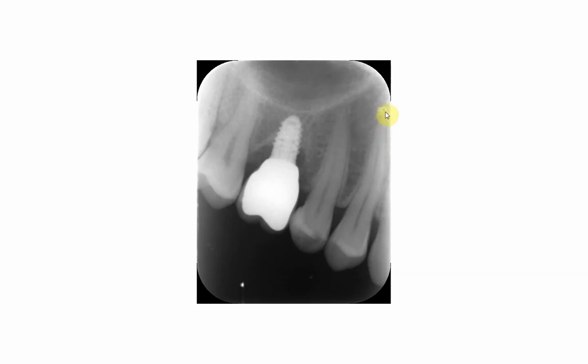There was a chance to capture the apices of these teeth, but as the distance increases between the margin of the tooth and the margin of the film, we will have a loss of the apex of the teeth. So to avoid this, the margin of the film should be equally extended from the very beginning of the film, the anterior part, to the last part. So the 2 millimeters would be even all through this distance. This is the best way to guarantee that the apices of all the teeth, or the periapical area, even in an edentulous area, will be seen.